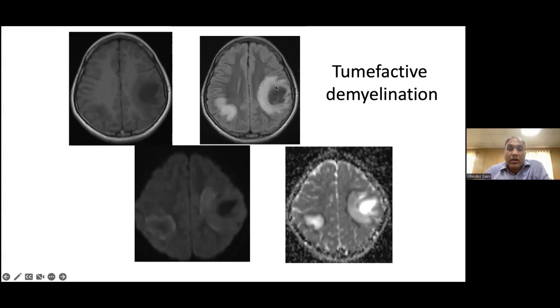If you see this necrotic area, the most necrotic part is towards the cortex. It's actually extending into the subcortical U fiber zone, whereas the part which is hyperintense and has some long transition zone is towards the white matter of the brain. So this morphology, diffusion weighted imaging, and the contrast study, everything gives a clue. And usually they will have a very short history. So clinical evaluation also plays an important role in the context in which we look at the image. So this is a case of tumefactive demyelination which can mimic a tumor.